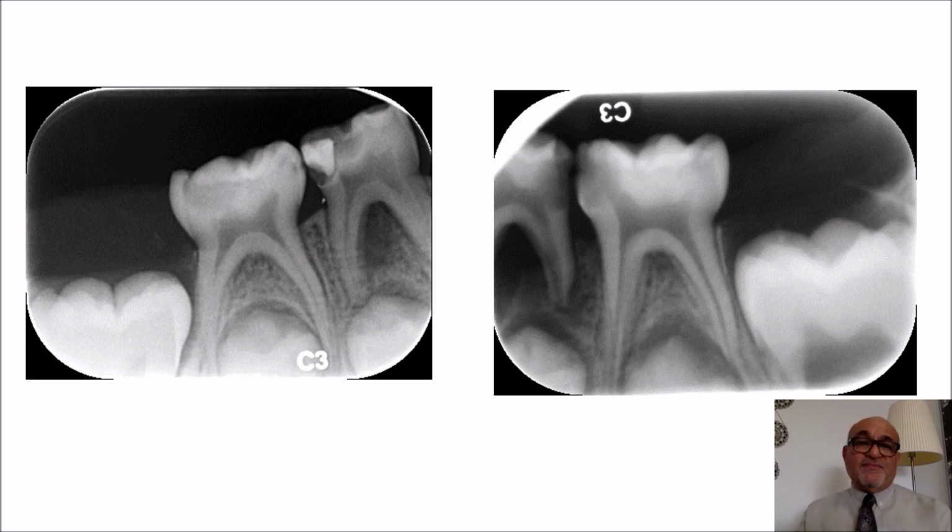Pedo, same patient, 6 over here, okay, and the 5 on 4, 4, 5, and the 6. Now, is this the maxilla or the mandible? I can say from the shape and the number of the roots of the deciduous teeth that this is for the mandible.